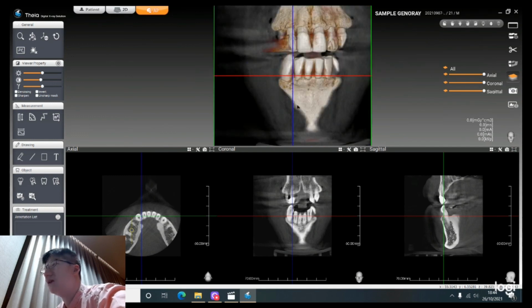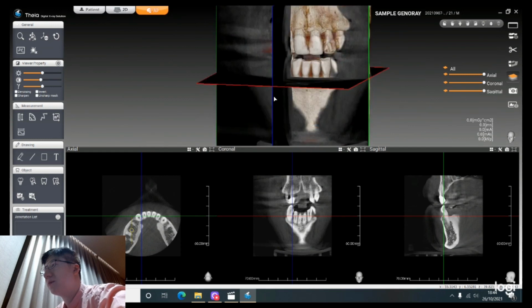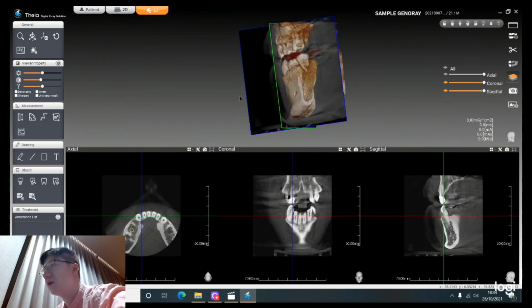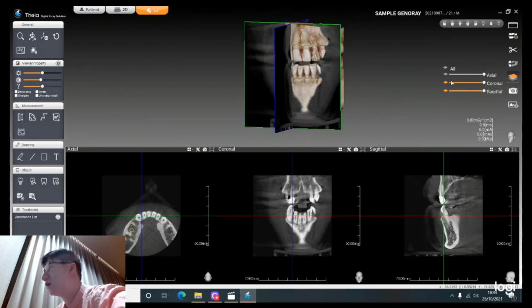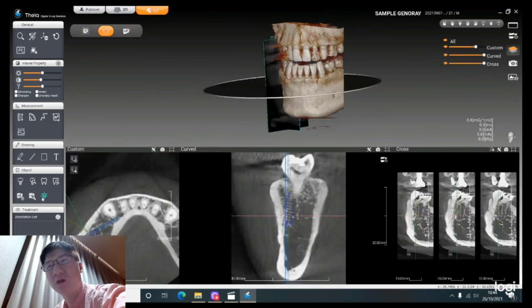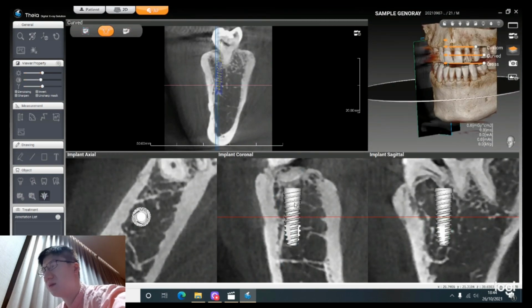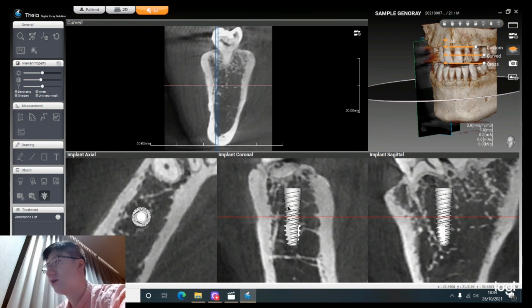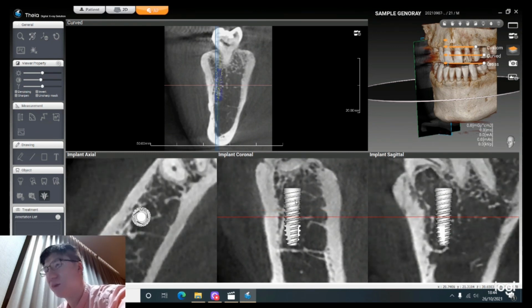Yeah, very nice. You had plane view, but you can just choose which planes you want to see. You don't have to look at all the planes, whereas you had to do that in previous versions. And you have CPMR and implant centric now, which was not possible in Triana before. So this is just nicer to look at your implants in this way.